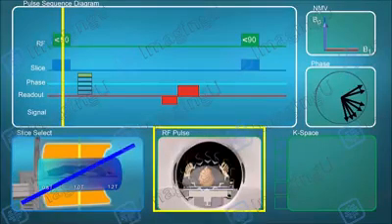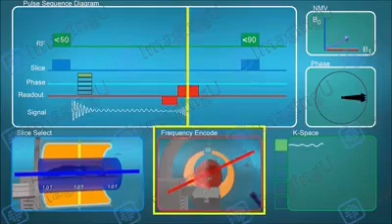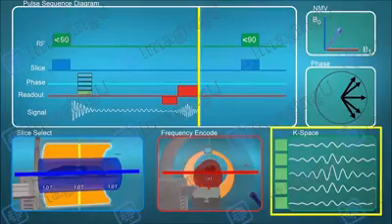You will also see when RF delivery, slice encoding, phase encoding, and frequency encoding are taking place from a hardware standpoint. In the upper right-hand corner, you will see a visualization of the net magnetization vector and its relationship to B0, or longitudinal magnetization, and B1, or transverse magnetization. Directly below the net magnetization vector section, you will see the phase section, which will provide information on the phase coherence of the protons. In the K-space section, you will see how we are filling K-space in individual pulse sequences with the recorded MRI signal.